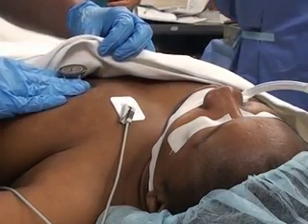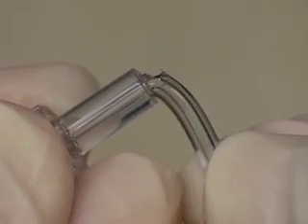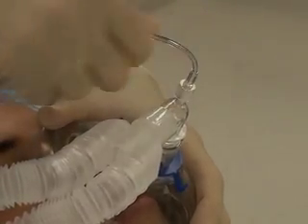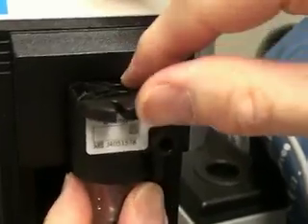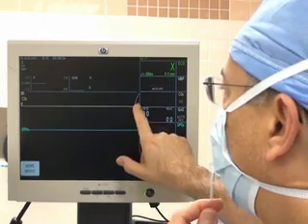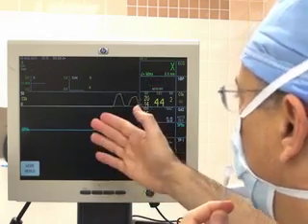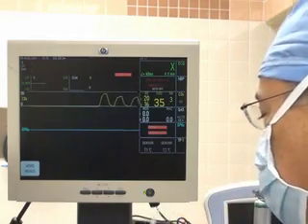If the patient appears to be clinically stable, consider the possibility of either leakage or occlusion of the sampling system. Make sure that the sidestream sampling line is well connected to the circuit and to the water trap on the capnograph, and that the water trap is firmly attached to the capnograph. To quickly test the integrity of the sampling line and monitor, breathe into the sampling line. A waveform confirms proper sampling, although small leaks diluting the sampled gas may go unnoticed.